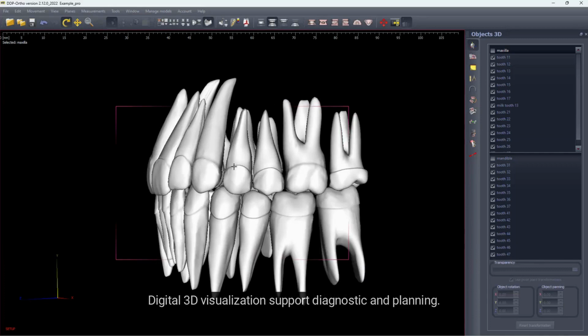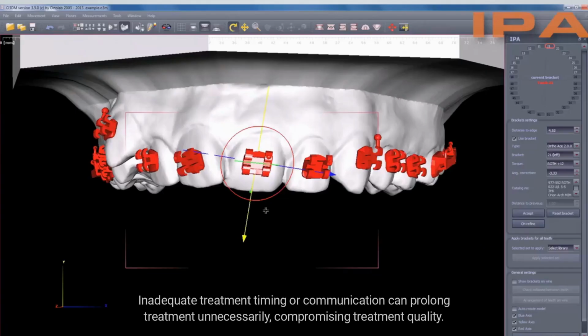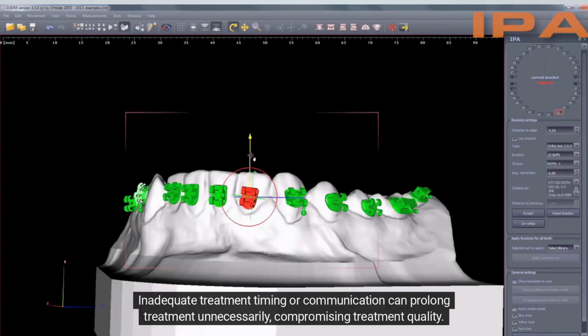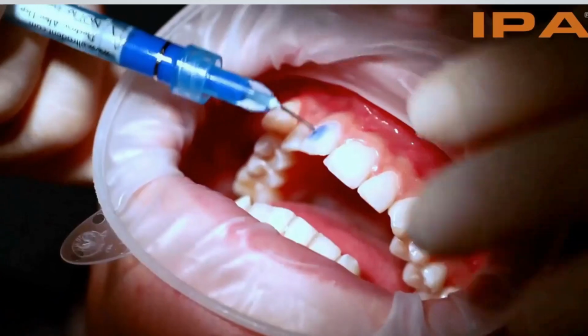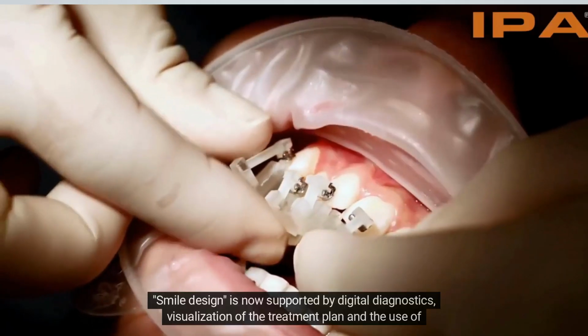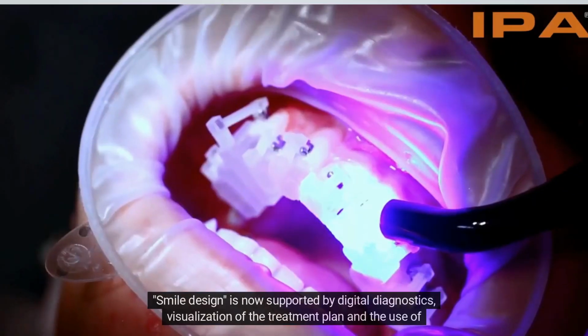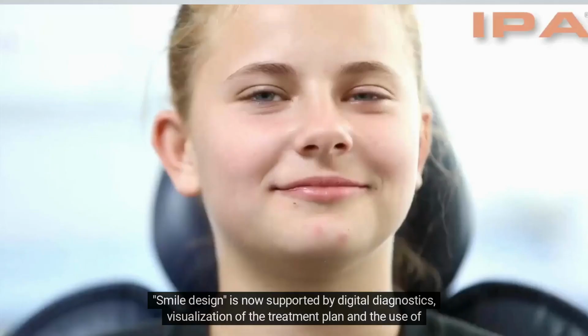Digital 3D visualization supports diagnostics and planning. Inadequate treatment timing or communication can prolong treatment unnecessarily, compromising treatment quality. A treatment plan and clear awareness of goals are important. Smile Design is now supported by digital diagnostics, visualization of the treatment plan, and the use of clinical navigation.